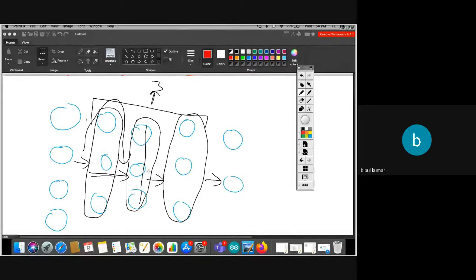In a sequential model I have to manually remove that hidden layer, but in the functional model, with a small change, we can just skip it. That's how the functional API works in Keras.